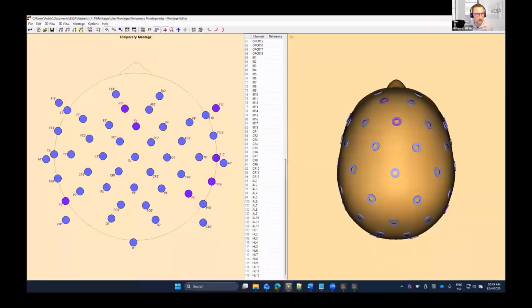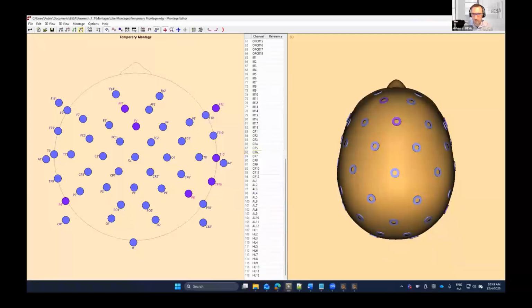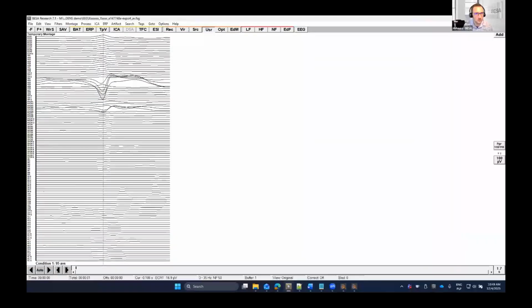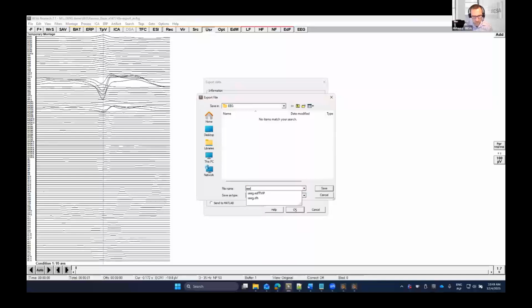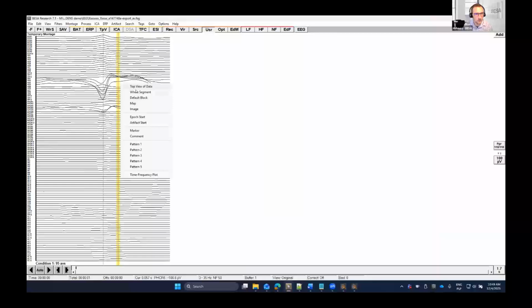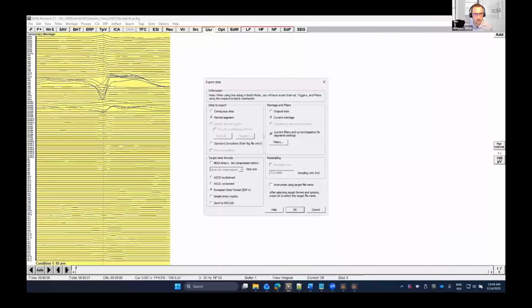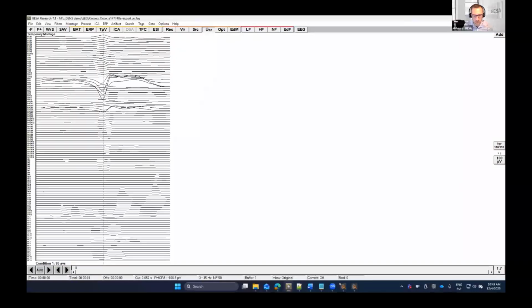So I will just save it as the montage then.